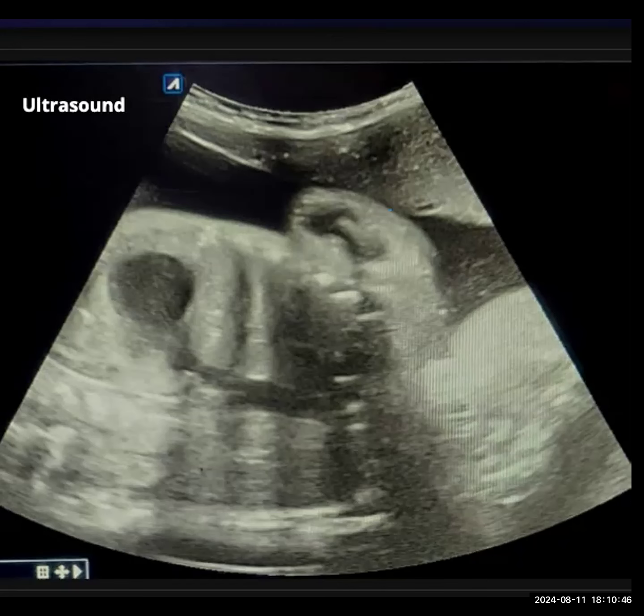Yeah. So I can see a fluid, an anechoic area with some echoes noted within, possibly near the renal fossa or in the region of the stomach. I am not very sure because these are not a dynamic set of images. Other than that, I can see the diaphragm very clearly on these set of images. Can you ask for control and show it to me?